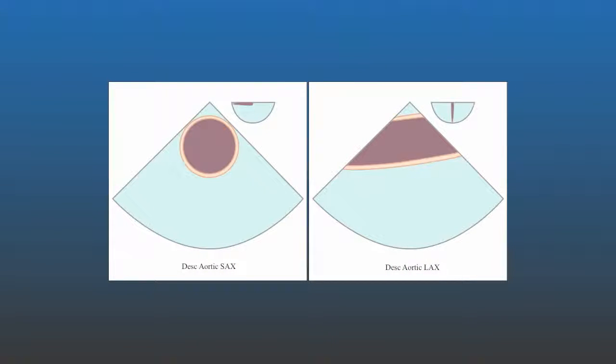While the HeartWorks simulator is not equipped to provide imaging of the thoracic aorta, this can easily be obtained in vivo by advancing the probe from the arch position or rotating the probe from the mid-esophagus. Imaging should be done at a scan depth of around 7 centimeters and conducted throughout the length of the aorta until it disappears from view around the level of the diaphragm.